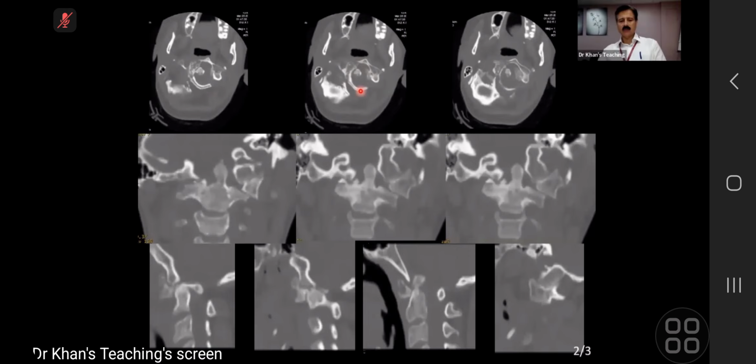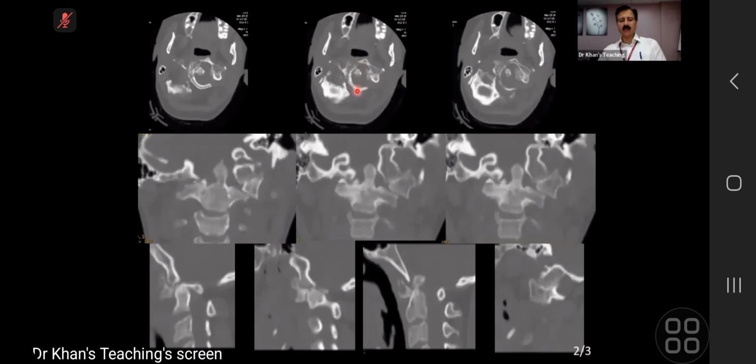And I can see the dens at the same level as the skull base bones. Excellent. So this becomes a very good exam film on an axial, where the examiner will open it and you have to pick up that the dens should not be projecting into the foramen magnum.